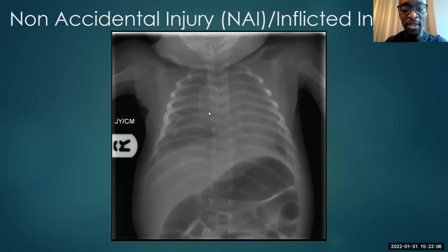So you've got all of this ground glass stuff because the lungs are not aerated. And actually with this one, the endotracheal tube ended up being in the esophagus, which was fixed later. Because you can see the tip's quite low, hey? The carina is probably up here somewhere. And yes, there is a pneumothorax. I'm ignoring the lungs, but I'm just showing you this for the purposes of the posterior rib fractures, which are both sensitive and specific.